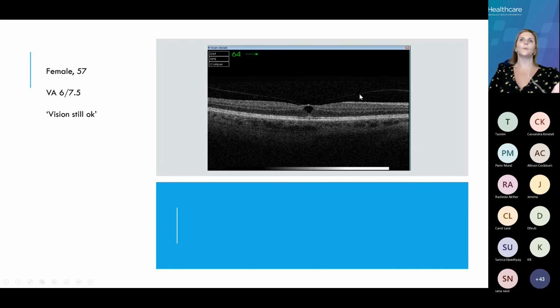So what are your thoughts here? So we can look again at our image. We haven't got the scan quality, but the scan is fairly good. We can see the retinal section, so we can interpret this scan. We've got our posterior hyaloid layer that we can visualize, okay, and we can see that quite nicely here. Our main point where we've seen the change, can you see you've got this little hyperreflective spot, which is our umbo reflex, but we've got the intraretinal cystic space that we are visualizing here. So we've got a cystic change, but actually our intraretinal section, other than that, either side is okay.